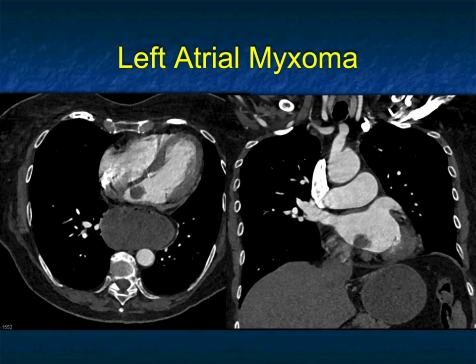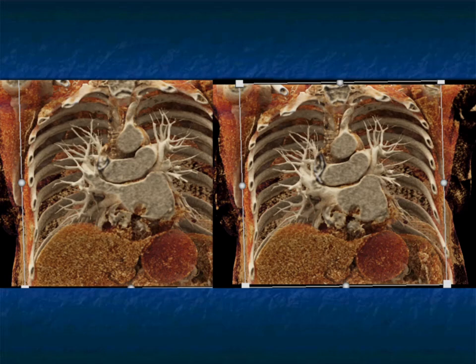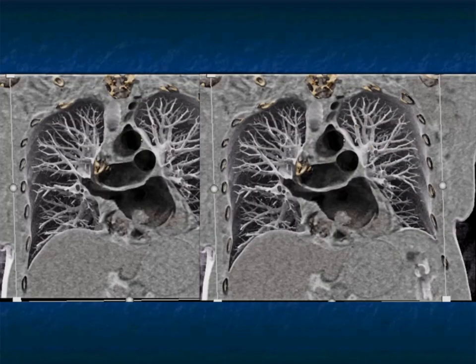But you do see that filling defect in the patient's left atrium. You could consider thrombus. Both would be on the wall. This is slightly irregular. You can see it has just slight lobulations, about 1.5 centimeters in size. Here it is very nicely, its borders shown on the patient's cinematic rendered image.